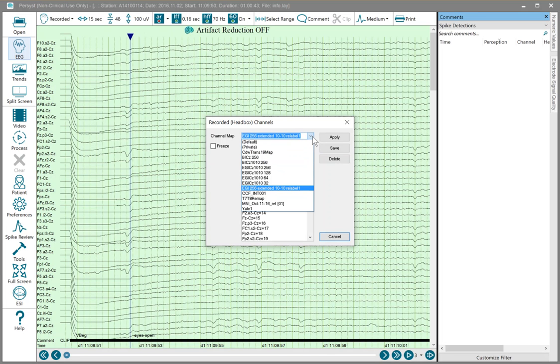Now, what you normally see are numbered inputs. And that's something important to keep in mind: in EGI, in the Mac software, you can do what's called montage operations, which can downsample the recording, remontage it, or change the reference. Ideally, you don't want to do any of that. You just want to get the raw recording without labels applied to it, because you can apply the labels here. And that saves some steps, and it also makes it predictable, because depending on where the reference is placed, that can affect other things. So we know these channel maps will line up properly based on the net that's used. So go ahead and just apply the maps in Persyst for that.